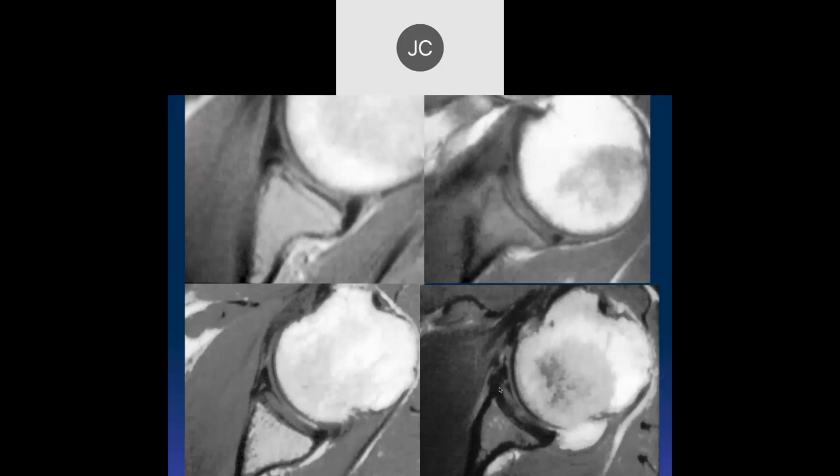And then here's an anterior labral tear that's really in a different direction. I think this patient had an unstable shoulder who probably had an anterior dislocation and sheared off the anterior labrum in that particular direction. So the yellow was normal. The reds are all different kinds of anterior labral tears.